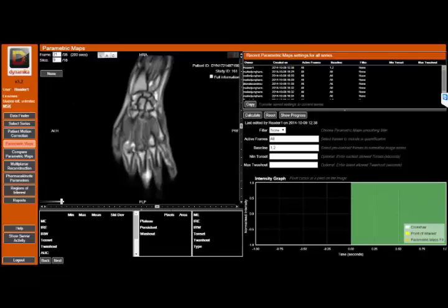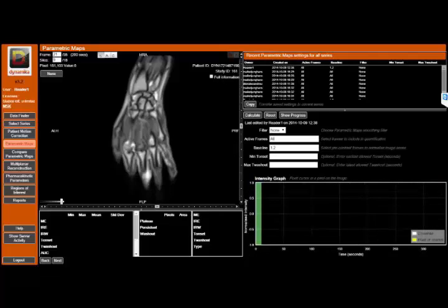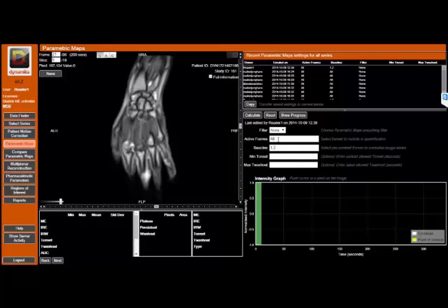So actually here I'll have the parametric map, and the parametric map has to be calculated in order to do the color coding as well as pixel value classification from the dynamic data. So I more or less always choose all frames as active, as I see a severe movement within one of the frames, as you can see here. No severe movement.